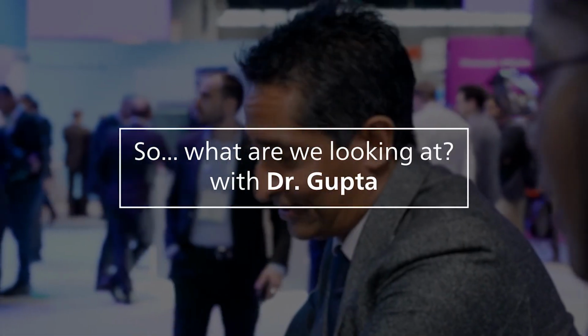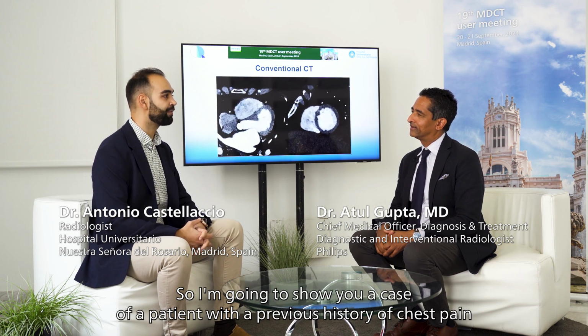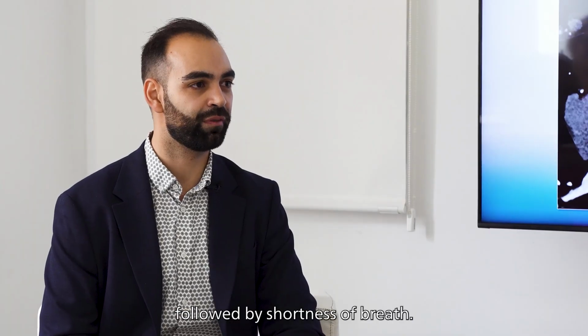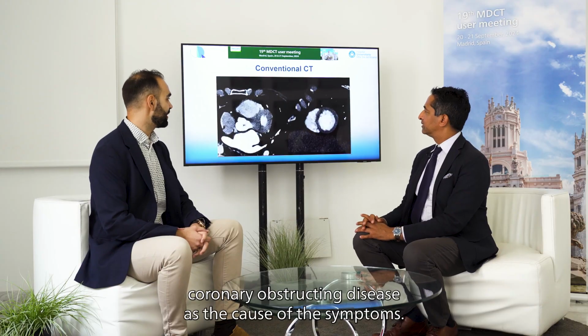So, what are we looking at? Tell me about this patient that you scanned. Yeah, sure, Atul. So I'm going to show you a case of a patient with a previous history of chest pain, followed by shortness of breath. And so the cardiologist asked for a cardiac CTA to rule out coronary obstructive disease as the cause of the symptoms.